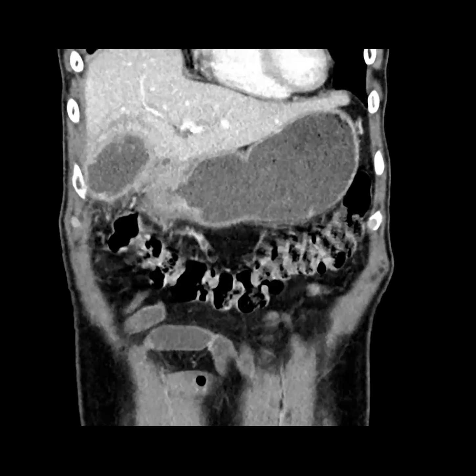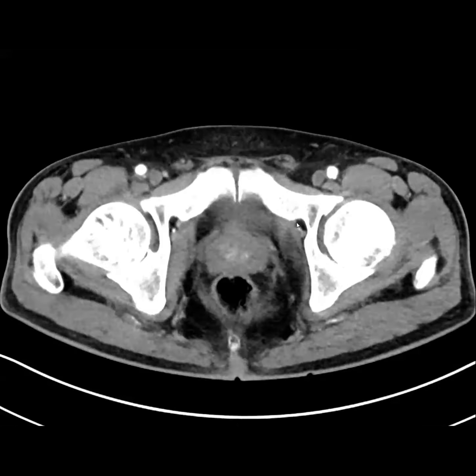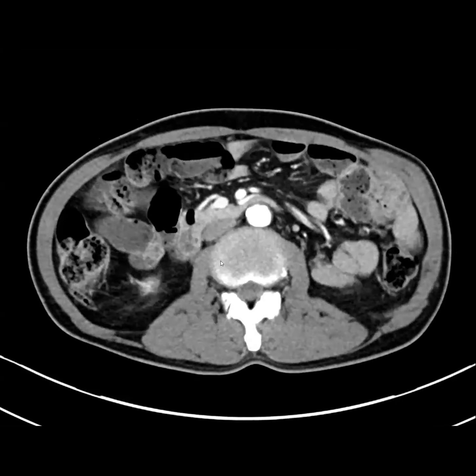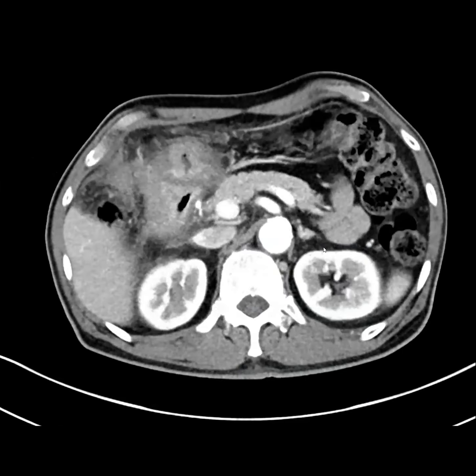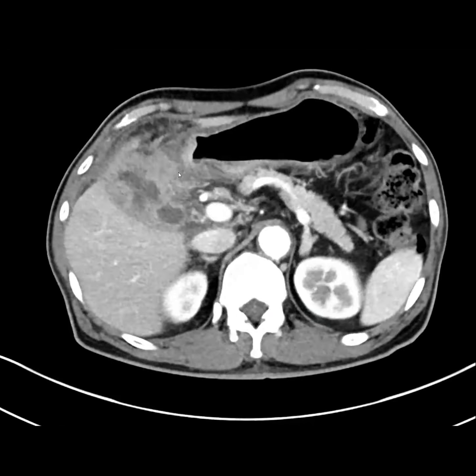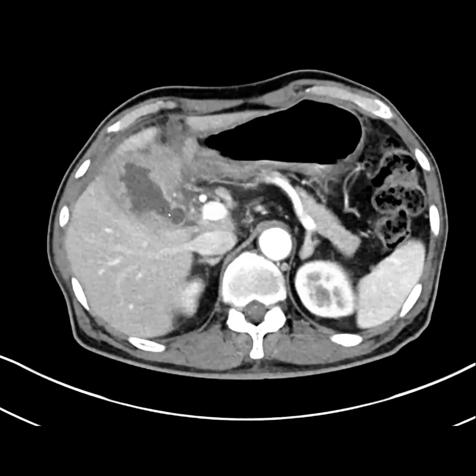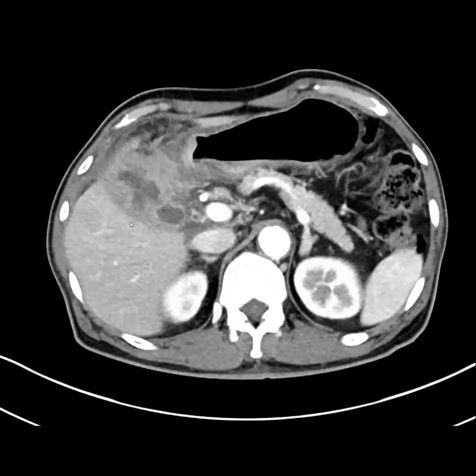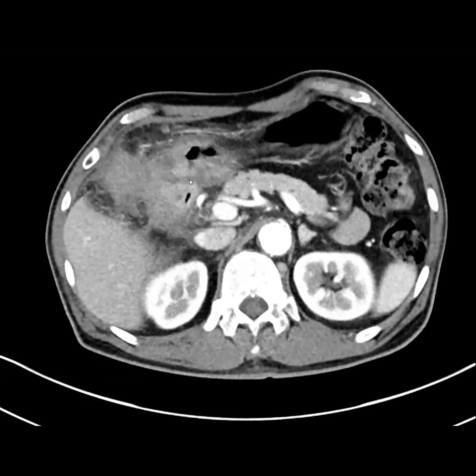And then this patient got a follow-up. This was the follow-up. You can see that the pylorus is still really thickened. The stomach is still really thickened. It looks really abnormal. The gallbladder still looks really abnormal, although now it's less distended and has a thicker wall. So people are like, oh, it still could be gallbladder cancer. But I will tell you, in the end, this turned out to be gastric cancer.